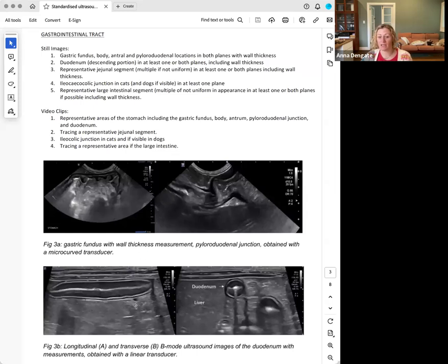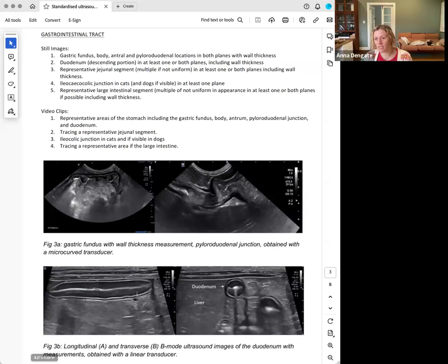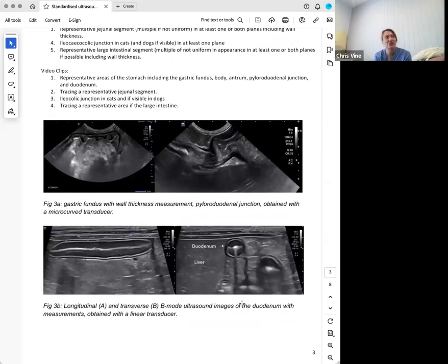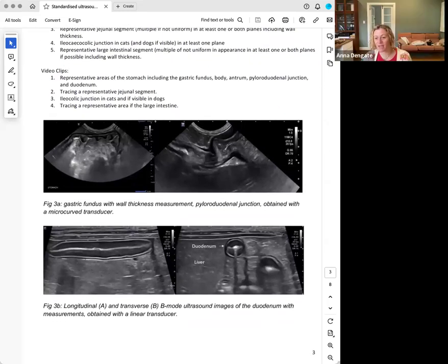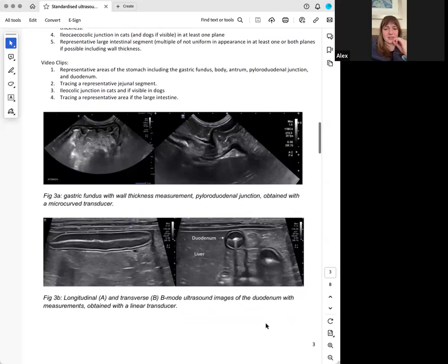If we start to see tiger stripes, what's that in the mucosa? What's that a marker of? Lymphangiectasia. Excellent. Which can be primary disease or secondary to IBD. So it's not necessarily just a straight diagnosis. It's not diagnostic. When else might we see tiger stripes? If they've had a fatty meal recently, so if they didn't fast them this morning.